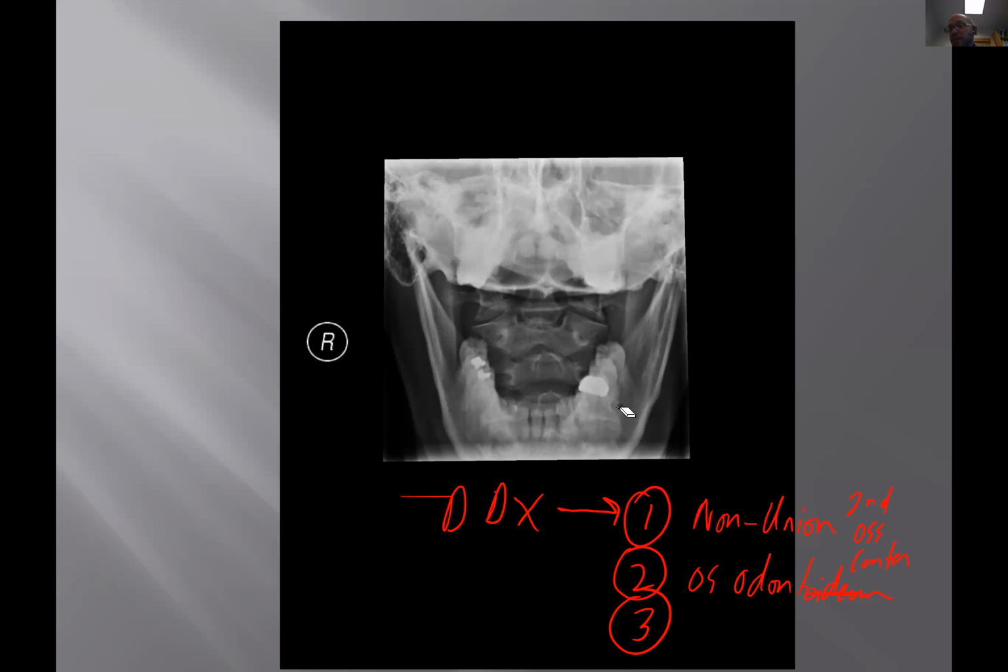Couldn't this be an old fracture? Yeah, basically, because you see the separation, but now it could heal that way. Yeah, I agree. I don't like it for an old fracture, but I think if we force ourselves to be disciplined to try to think of three things, we'll be way better at integrating our radiology into our chiropractic practice.